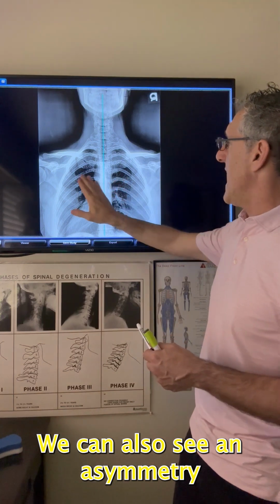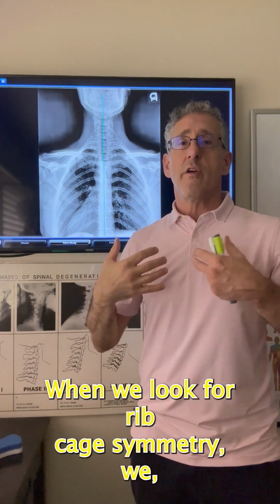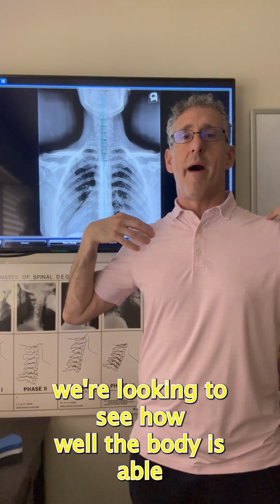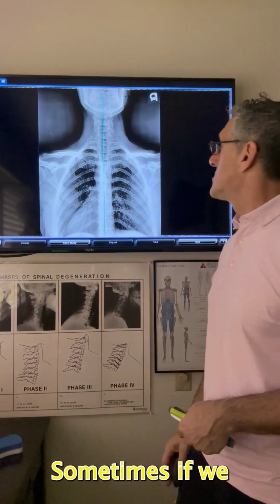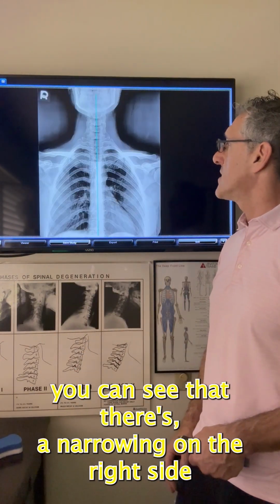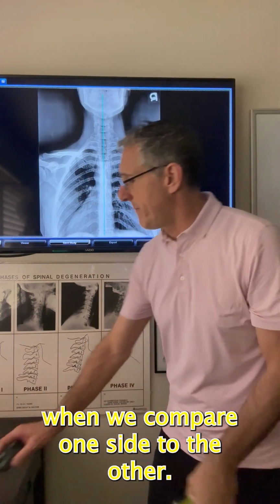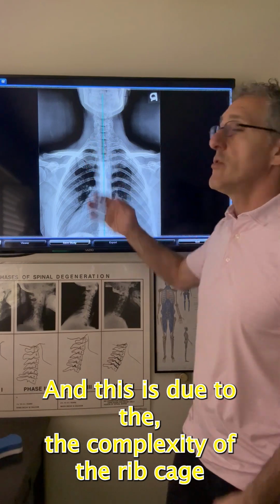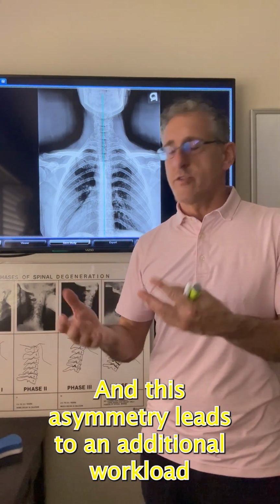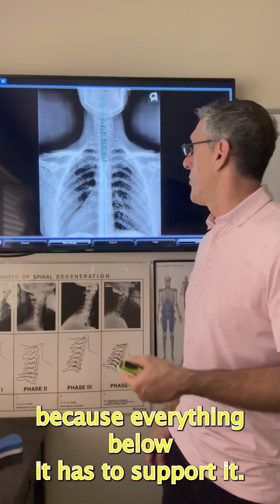We can also see an asymmetry in the rib cage through here. When we look for rib cage symmetry, we're looking to see how well the body is able to support the shoulder girdles. Sometimes if we make the film toggle back and forth, you can see that there's a narrowing on the right side and a widening on the left when we compare one side to the other, and this is due to the collapsing of the rib cage and the rotation through there. And this asymmetry leads to an additional workload in the lower back because everything below it has to support it.